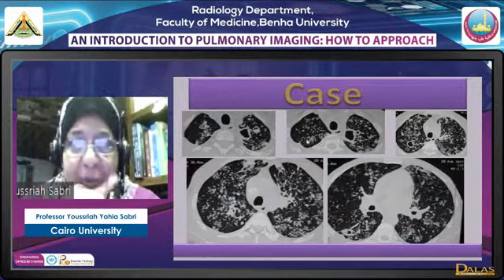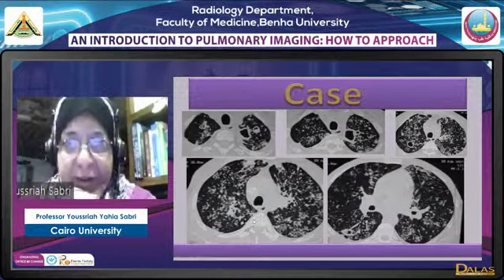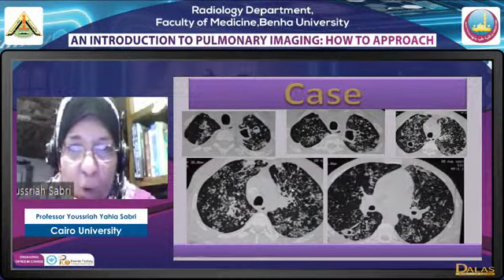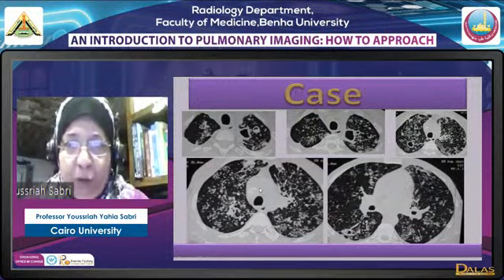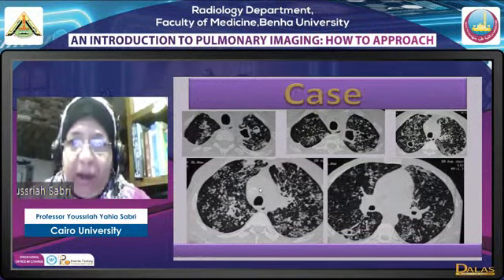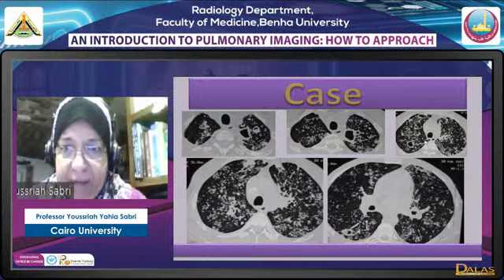What do we have here? We have again multiple nodules, but they are different in appearance than the miliary. They are bigger, they are denser, and they are more irregular. These nodular appearances are what we call acinar opacities. Here they are associated with a cavitary lesion in the apex, with cavitation, with mycetoma, cavities and cavities with mycetoma.